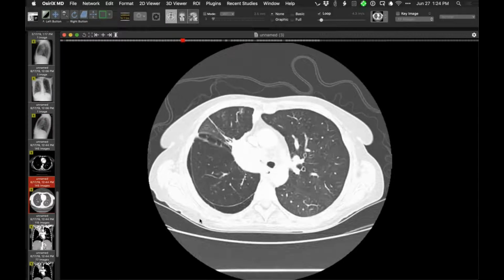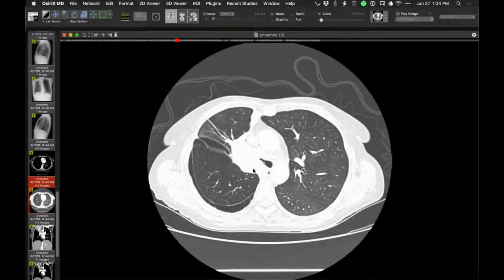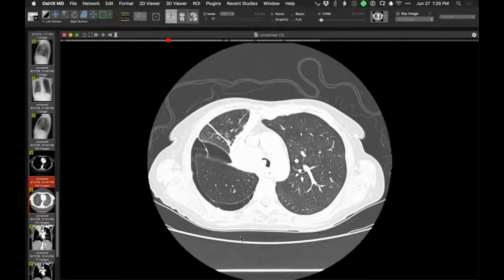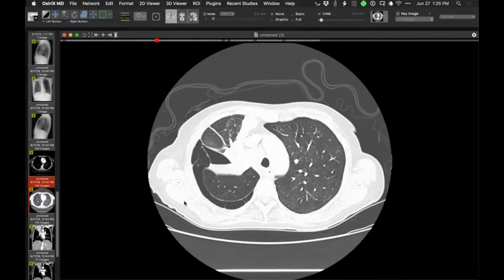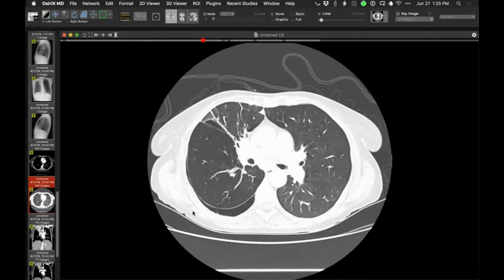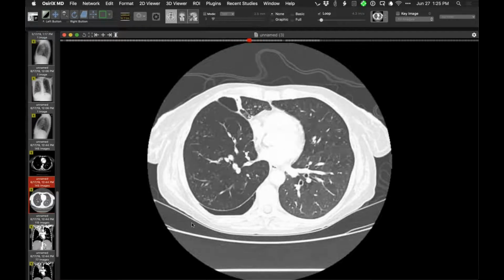So here you'll see extensive abnormality. You'll see the pneumothorax. I guess there's some adhesions traversing the pleural space. Here is the tumor that's growing, and this is confirmed. So delayed diagnosis of a large central tumor that ultimately presented with pneumothorax ex vacuo. So that doesn't need a chest tube. It's just something that can happen with obstructive atelectasis. I think it's the largest one that I've seen.